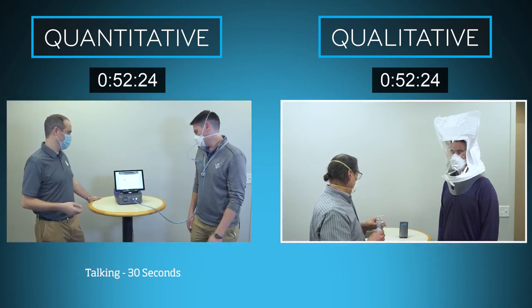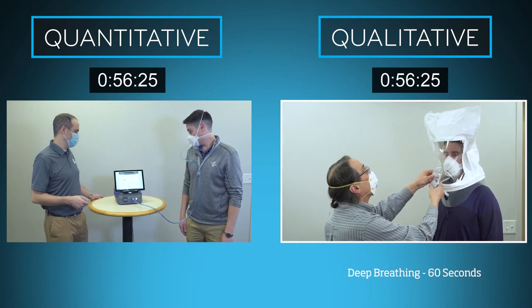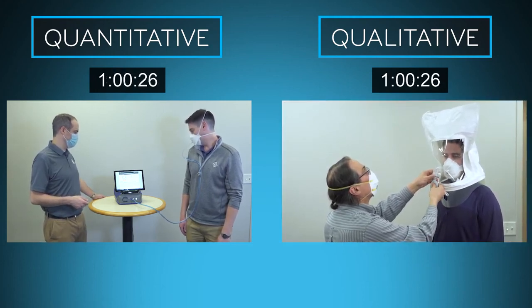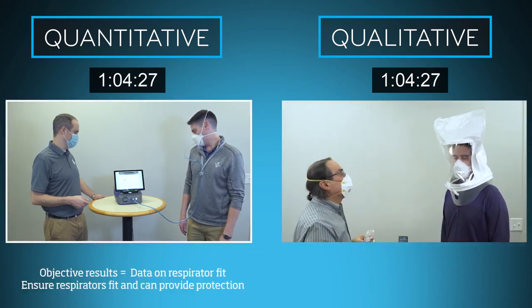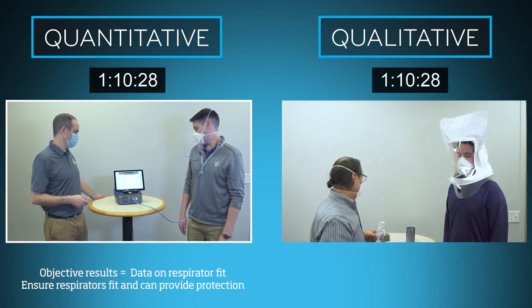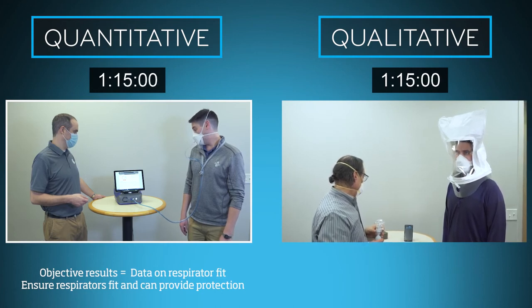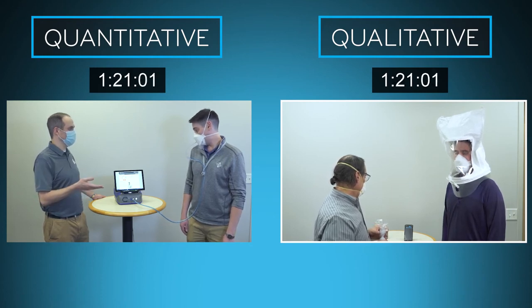For the qualitative method, the second exercise is deep breathing for 60 seconds. While the relative timing of each method is the most obvious difference, this is only part of the story. With quantitative fit testing, you get objective results that provide data on a respirator's fit and performance throughout the fit test. With this information, you can better ensure that respirators will fit and protect your employees in real-world conditions. Qualitative fit testing simply cannot provide the same insights you gain with a quantitative fit test.